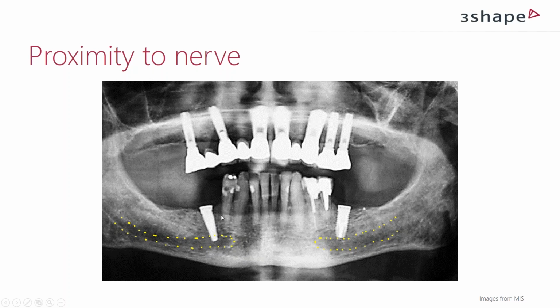So this is common in the area where you don't know the bone, you don't know the quality, the size, volume, because you didn't do planning. And when you did planning, you didn't use the guide, so the implants could actually end up in some other place, even if you did just the planning part. So of course, talking today about Implant Studio and the possibilities and predictability with Implant Studio, it says itself. Here you should have used a guide instead. Even if it looks simple, the problems can be big, and then it's wasted time and money.